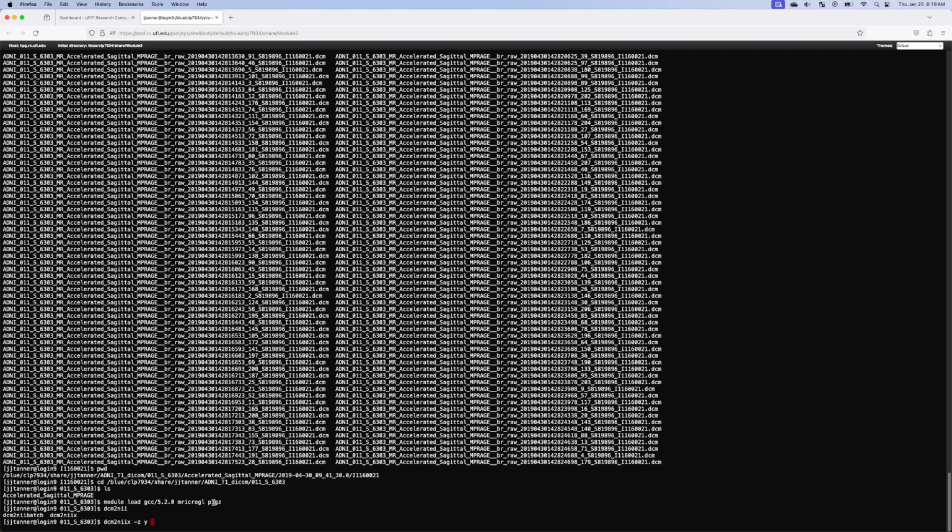And so we're going to compress it, and then I'm also going to give it a file name that is going to match sort of a BIDS naming convention already. And so to do that, what we can do is -f, and there's a space, and then I'm going to do sub, and this is just a naming convention, dash, and then we'll do the 011.